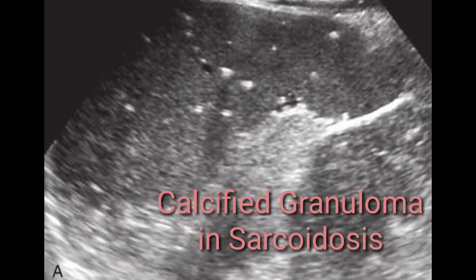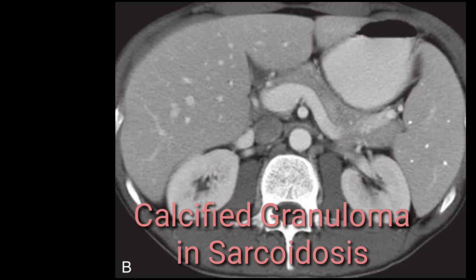definitely sarcoidosis. In the presence of previous record and other investigations, the ultrasound features are suggestive of granulomatous nodules, likely sarcoidosis. This is a CT scan image of a sarcoidosis patient. Ultrasound image has been already discussed. For the confirmation of diagnosis, CT scan was performed for that patient.